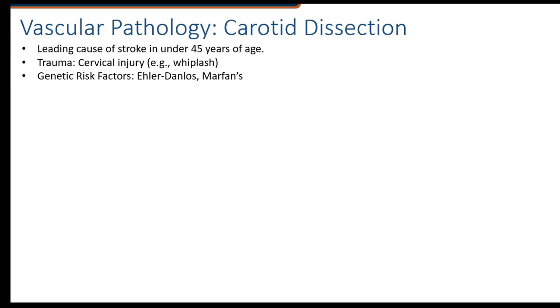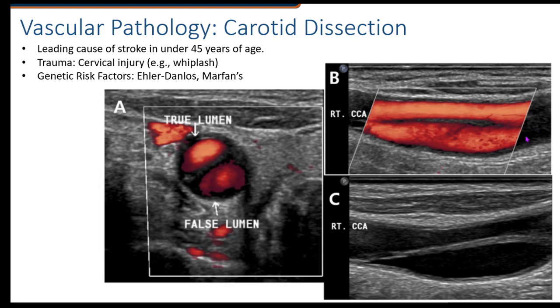And so when we look at it in terms of the vessel, here is the intima that's been pulled away, and this is the false lumen here, and flow should be going through the true lumen in this picture. And what happens is, again, this is an injury, and so with injuries, of course, you can develop some clots in that, and those clots can break off and move up to the brain and cause stroke. With color flow, some of that blood can get caught up into that false lumen and add some insult to injury to this pulling away.